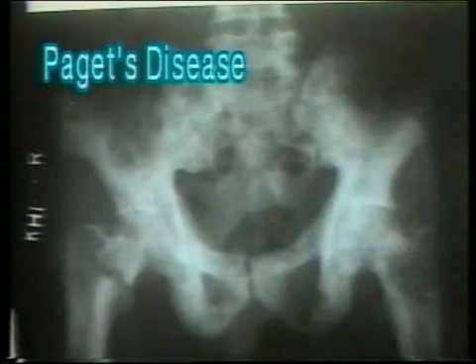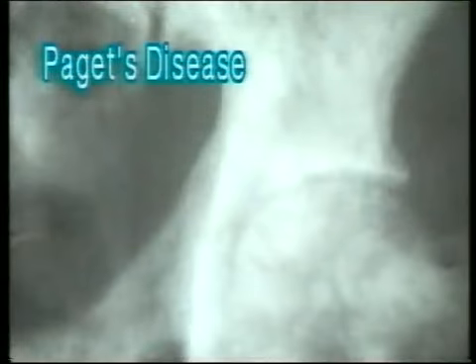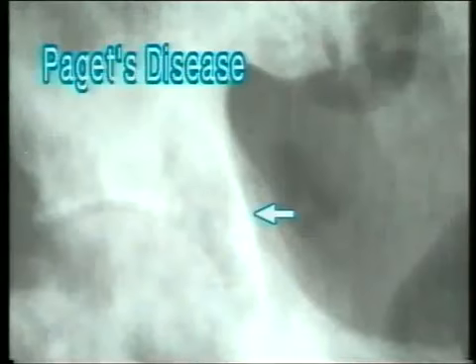Paget's disease. This pelvis shows multiple sclerotic areas. But in contrast with the osteoblastic metastasis of carcinoma of prostate, this is a combination of sclerotic and osteolytic areas. Secondly, there is thickening of the cortex, best seen at the pelvic rim. Note the dense white pelvic rim shown by the arrow. The trabeculae are very coarse, but that is not apparent on the TV screen.